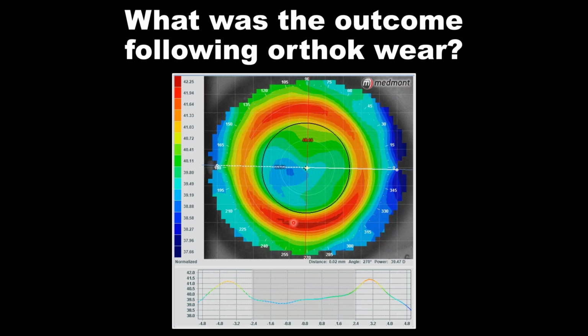Well, is this a smiley face? Is that the paracentral steepening that's associated with a smiley face outcome? Or is this a frowny face outcome? Is that the upside down smile, the frown that's associated with an inferior outcome? Or is this a bullseye, looking at the red ring following the pupil? It's certainly not a central island. There's no central steepening that we see here.